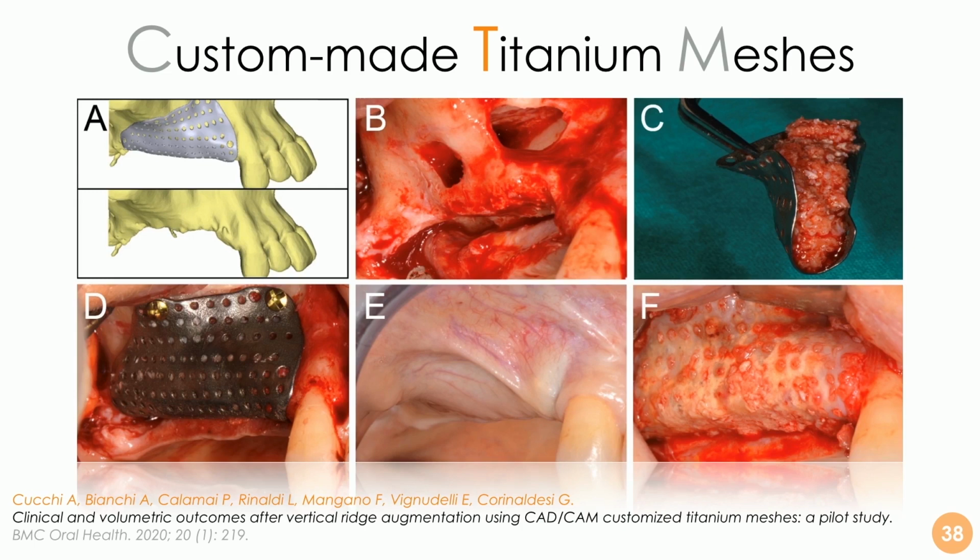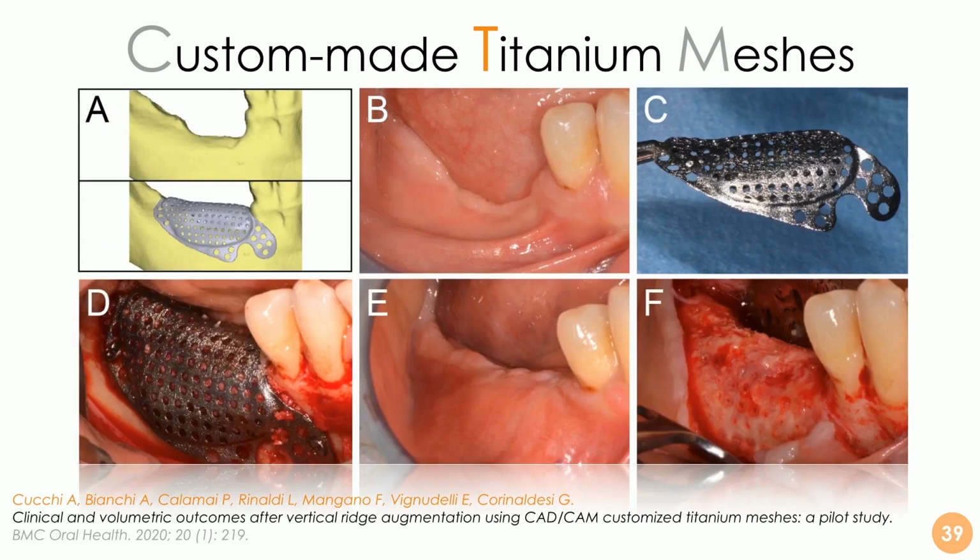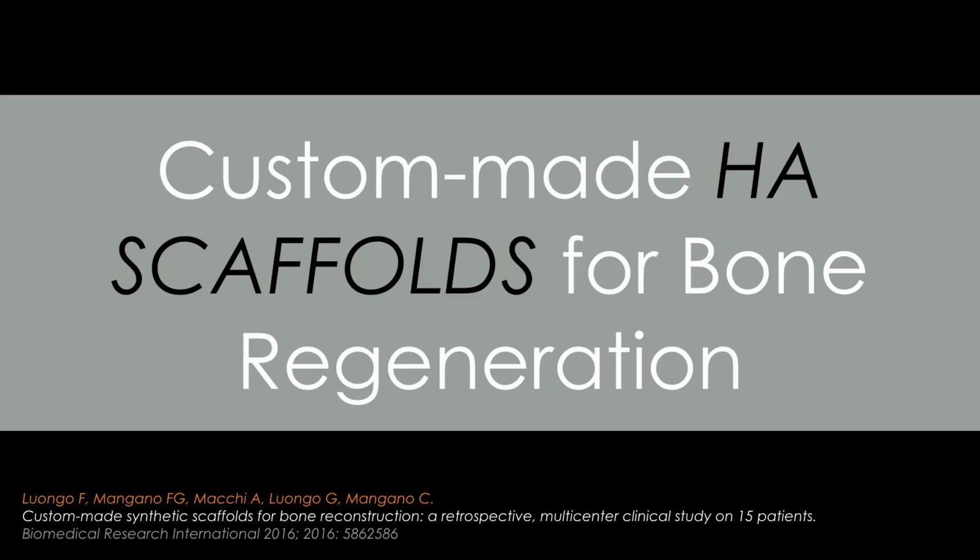So for the patient who wants to undergo bone regeneration, we have this option that is custom and comes from the cone beam computed tomography. Once again, as we can see, a lot of beautiful cases made by Dr. Cucchi, and very satisfactory results at the end from the clinical point of view and in terms of the volume gained, and the possibility to place the implant later without any problem or complication.